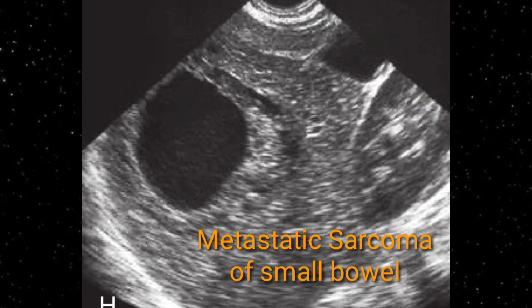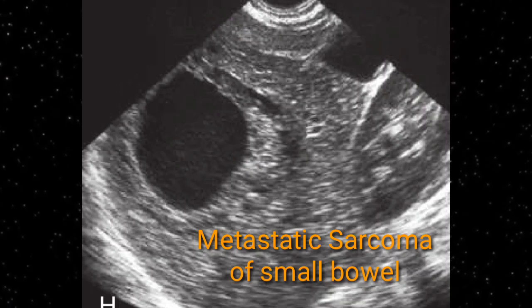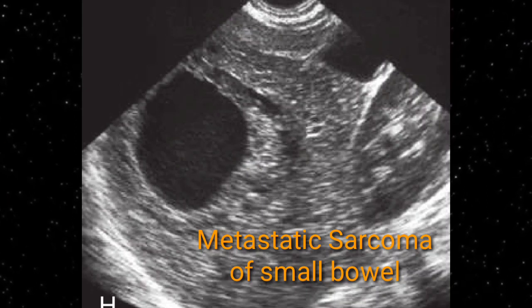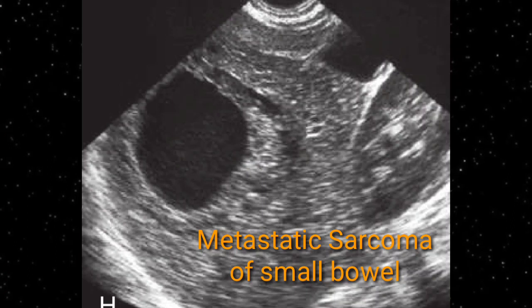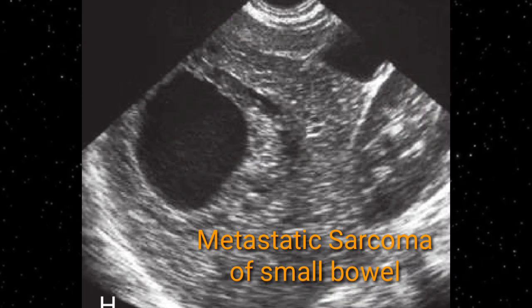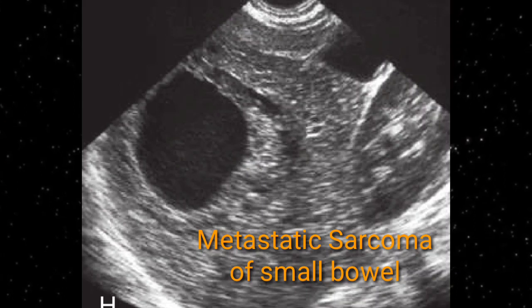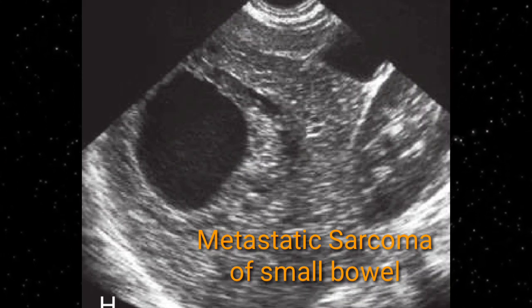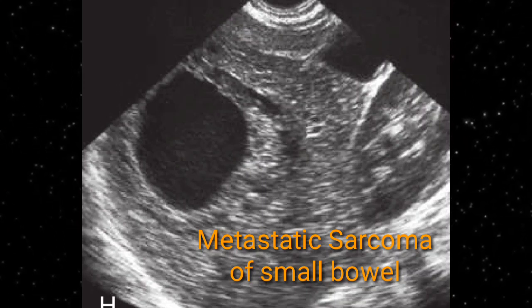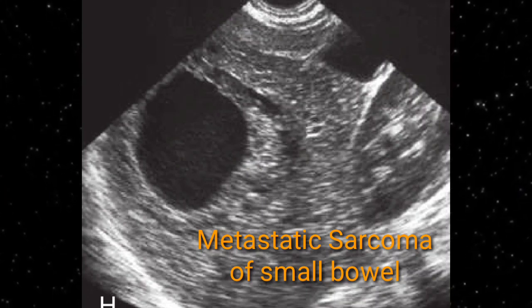Here is another slide of cystic metastasis for you. This is small bowel cancer, and you can see its cystic mets within the liver. Here this cyst looks like a simple cyst, no marginal irregularity, no thick wall, no intramural nodule is visible. But one change you will be able to appreciate is the interface between the liver and the cystic mets. This is actually a reactive response to the lesion and can be picked up if you carefully scan the patient. Otherwise, this case can be easily missed and labeled as a simple cyst.